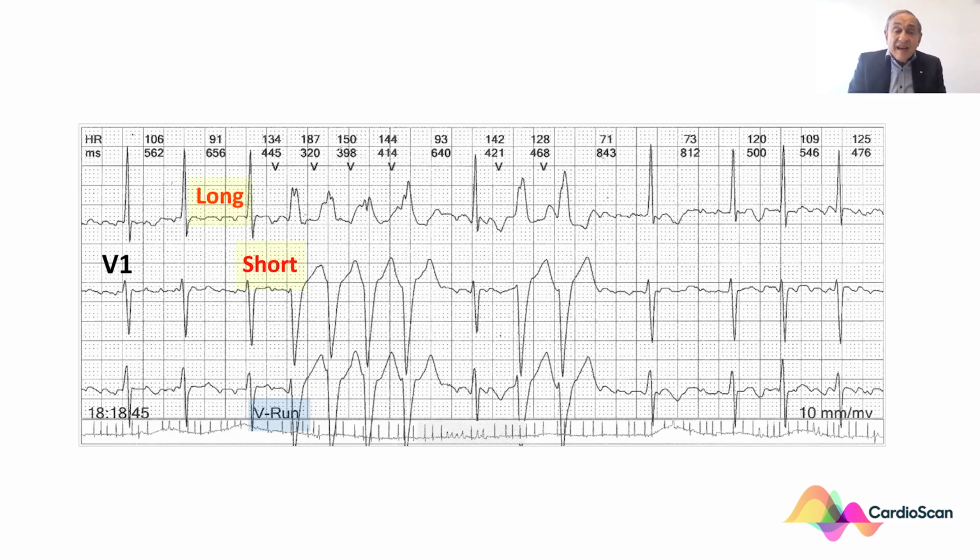But there are long, short periods. We have got a rapid wide QRS, but this time a left bundle branch block, and another one exactly the same. So this clearly is an aberration, even though we do not have a right bundle branch block. But when we see this situation, look at other parts of the tracings, because we often see a right bundle branch block as well.